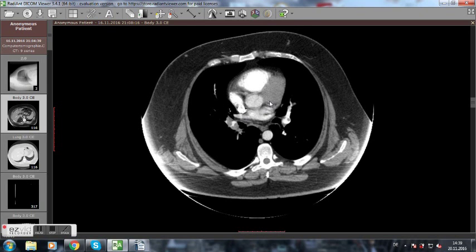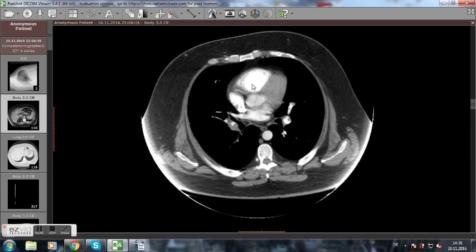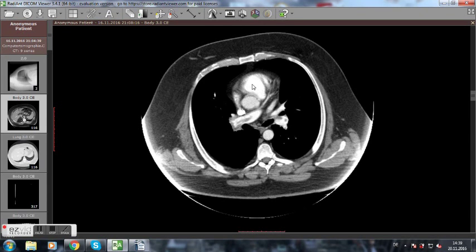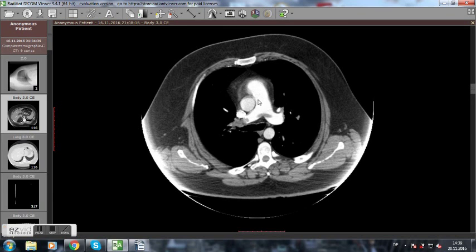I will show you here. So this is the heart, and this is the superior vena cava, and it's making its entry here in the right atrium, and then in the right ventricle, and from there it's going to the truncus pulmonalis, which is this structure here, and this is already a blood vessel which is then dividing into the pulmonary arteries, the right one and the left one.